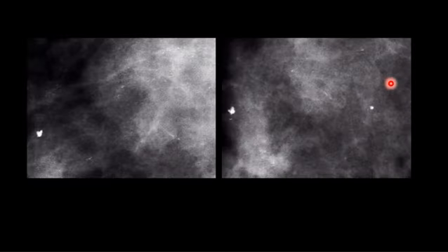This is a different patient also. This was some kind of ointment called Neosporin on the skin. And you can see there is some faint microcalcific foci distributed here in addition to this macrocalcific foci. Follow-up images after the skin is cleaned confirm that it was just an artifact. You compare this area with multiple microcalcifications, clean the skin, repeat it, and you have only these few macrocalcific foci of no clinical significance. Okay?